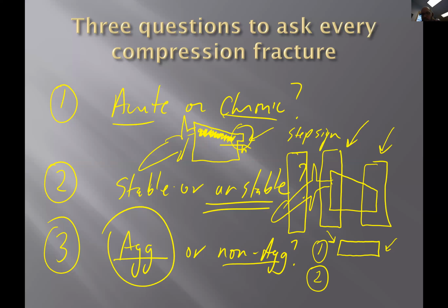And of course, the second, if you see destruction, obviously, if there's destruction of bone, the bone just doesn't look healthy. It looks like there's some moth-eaten bone destruction and a compression or a missing pedicle at that level. Some evidence of destruction, then you got to go aggressive.